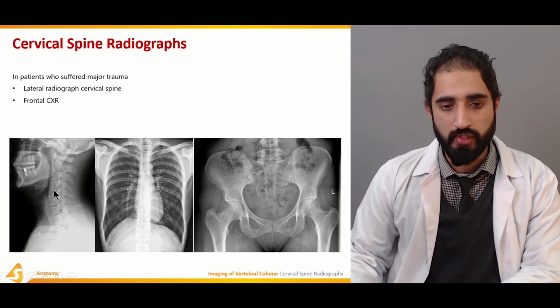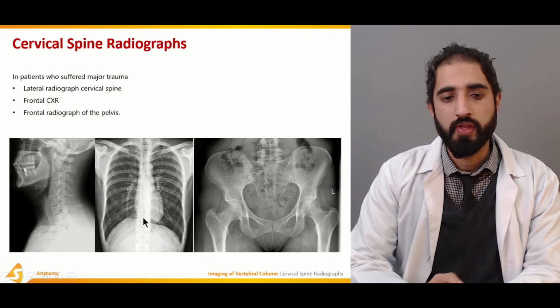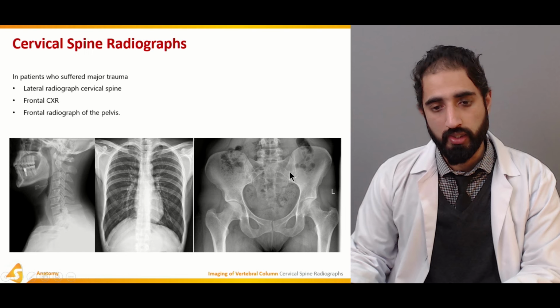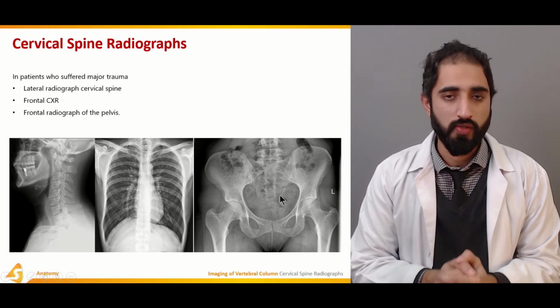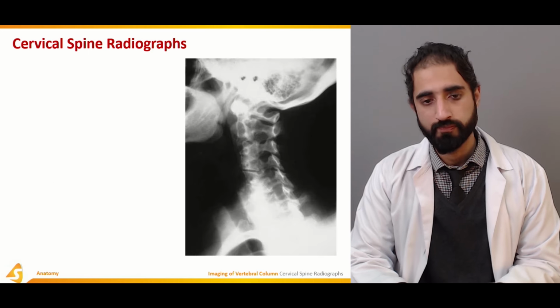As you can see, this is the lateral cervical radiograph, this is the frontal chest x-ray, and the frontal radiograph of the pelvis, as you can see here. So whenever we have a patient who has suffered major trauma, these 3 x-rays are mandatory for that person.